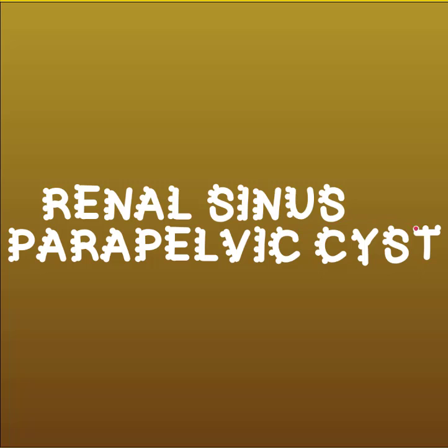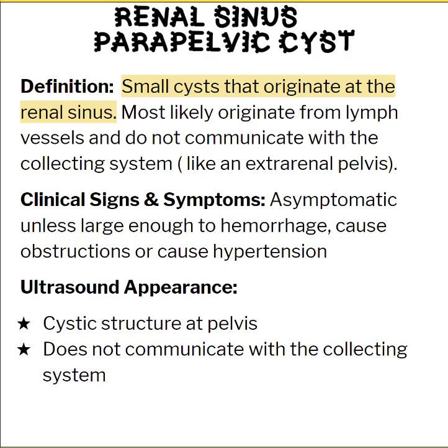Next up, then, we have renal sinus parapelvic cysts. Now, renal sinus parapelvic cysts are going to be cysts that originate at the renal sinus. So these are going to be closer to the urinary collecting system. These are thought to arise from lymph vessels within the area, and they become dilated, filled with lymph fluid, therefore appearing like a cyst.